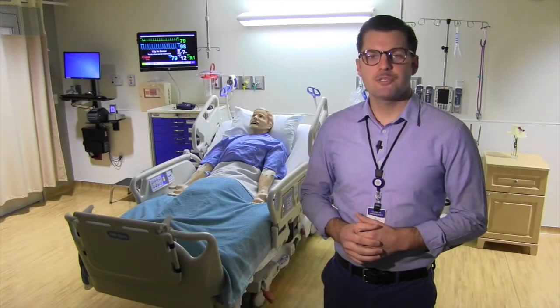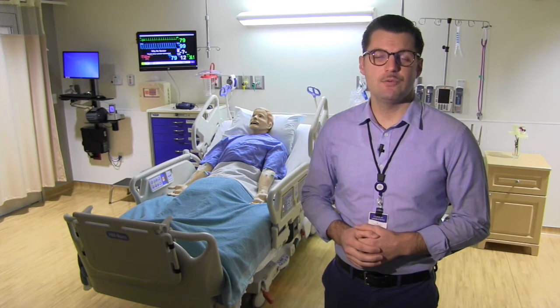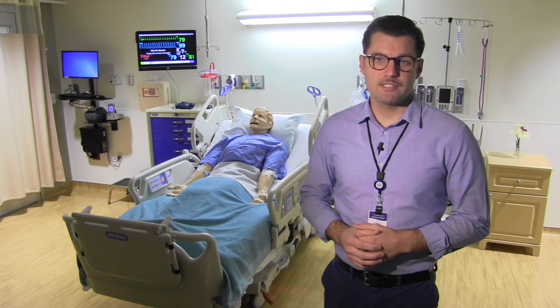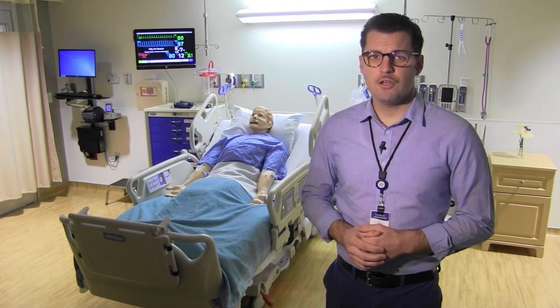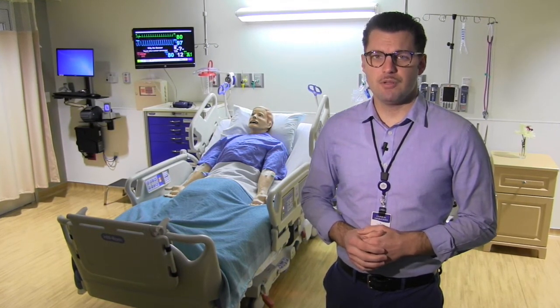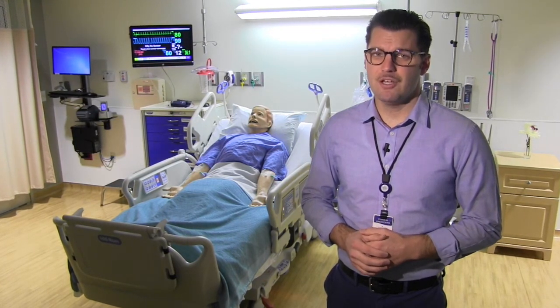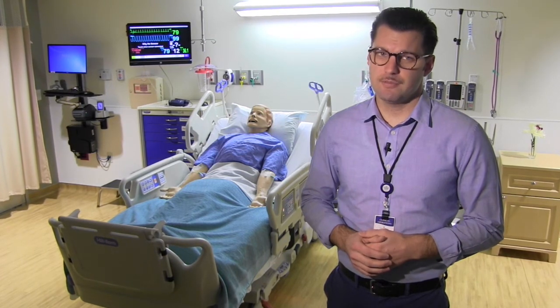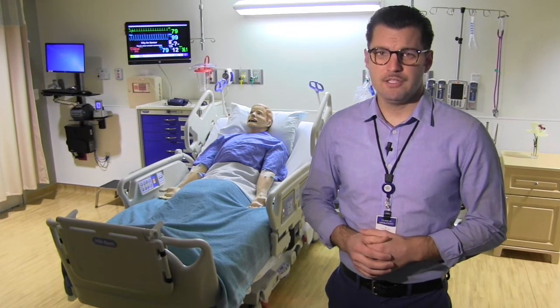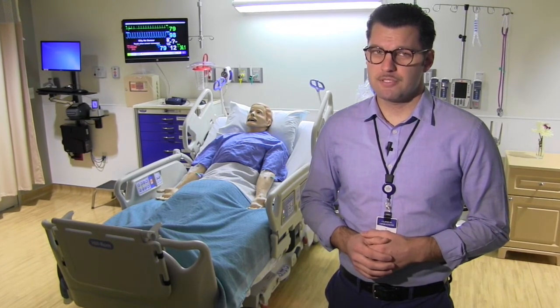When your scenario is complete, we want to make sure that none of the supplies used in the simulation leave the room. Many of these supplies can be collected and reused for future simulations. We also want to ensure that no simulation supplies are ever taken to an area where they might be used on an actual patient, causing them harm. Please check your pockets to make sure you're not taking any simulation supplies with you. This includes any syringes, vials, medication, or IV caps.